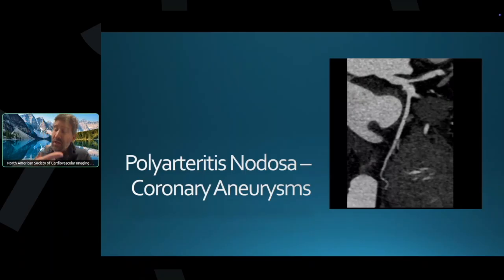This is the only case I've seen of polyarteritis nodosa involving the coronary arteries. And you have aneurysm and areas of stenosis, a little bit of accelerated atherosclerosis too. This also was a younger patient. So don't forget those other vasculitides that can also affect the coronary arteries.